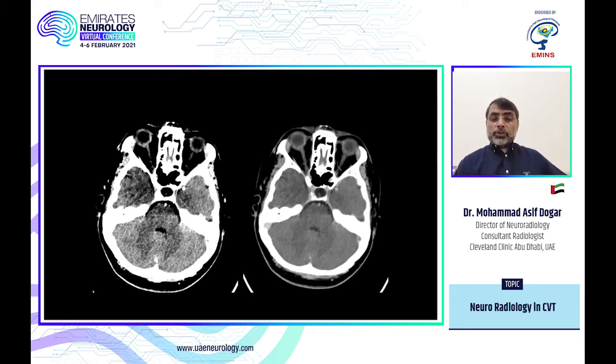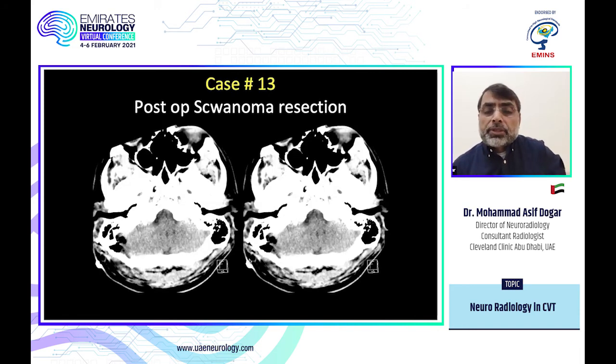And here of the same patient, hard to see anything on this image. We change the window and you can see the filling in the sigmoid sulcus or the sigmoid sinus. This patient has had surgery. So whenever there's a posterior fossa surgery, I look very hard at the transverse and the sigmoid sinus. I cannot see anything here.